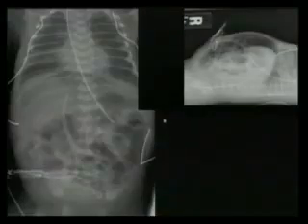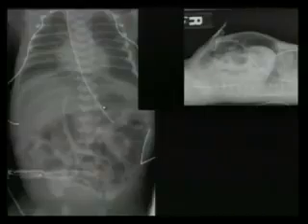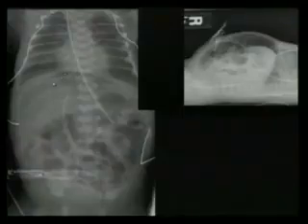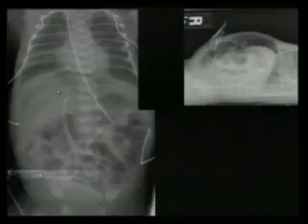This is very important. First years, don't look at this one, you've already done it. But the NICU is going to have a KUB. These babies are going to be on their back. And you've got to recognize this continuous diaphragm sign. And you've got to know that the liver should be here and should be white. The liver is white, but what color is this? This is black. This is too dark. We don't see the falciform ligament sign, but sometimes you'll see a little white line here. That's the football sign, the falciform ligament with air on both sides of it. When you see this, you call them up.